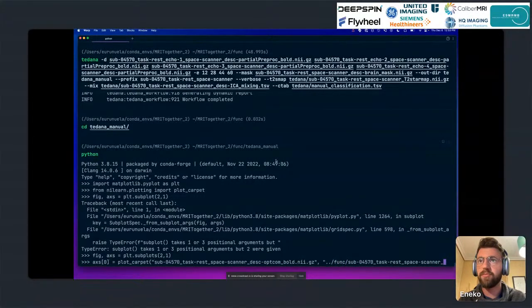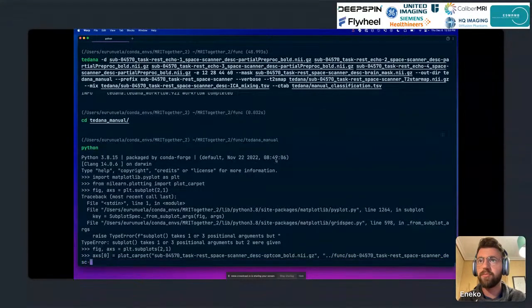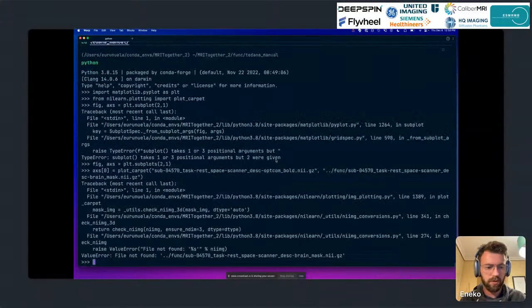So prefix, and it's desc dash brain mask.